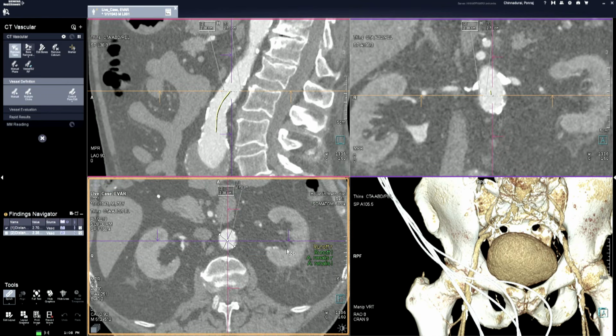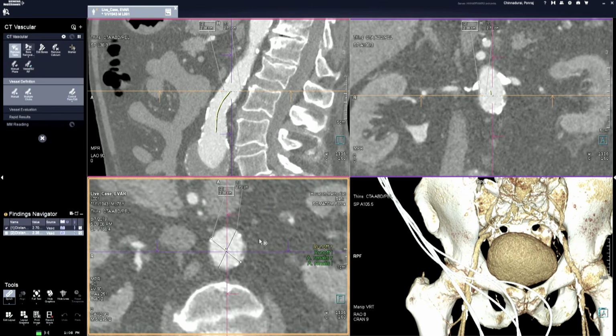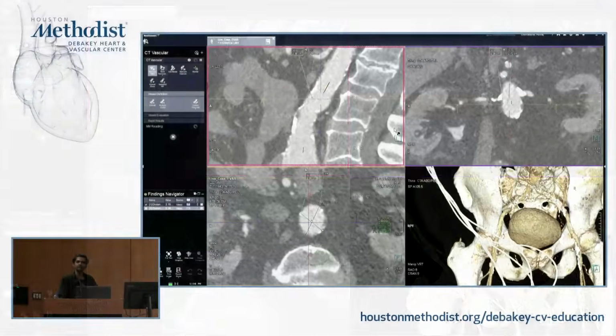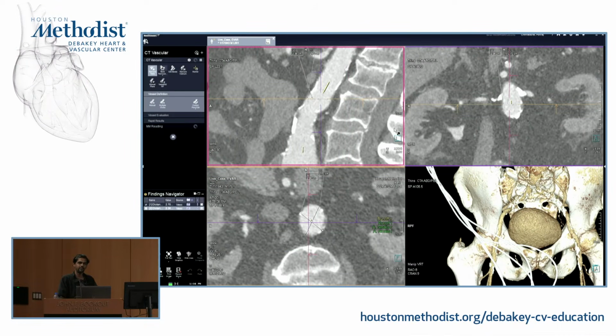So when we measure the axial diameters in this particular plane, we are not really measuring the true aortic diameter. We are measuring where this orange line is cutting through. Do you see what I mean? This is one of the most common reasons why we get errors when it comes to sizing, and this can translate to type 1A endoleaks, because most often people don't do these 3D multiplanar renderings.